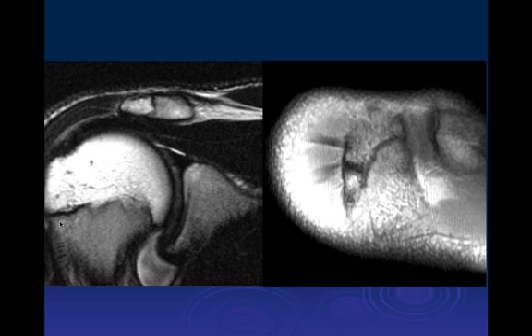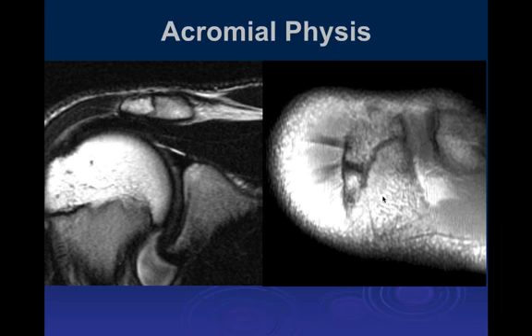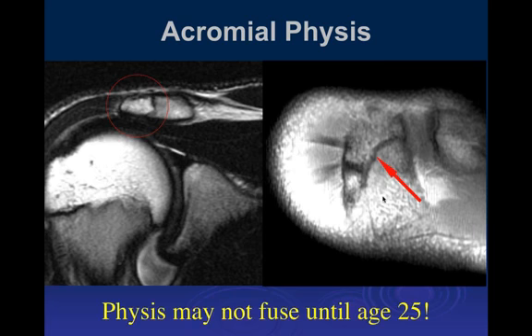And here's someone where the growth plates haven't completely closed yet, but they're almost closed, and this is just normal anatomy in a late teenager. So just be aware of that. If I'd hit the space one more time here, I would have seen the word physis. Oh, thanks, John. You're correct.